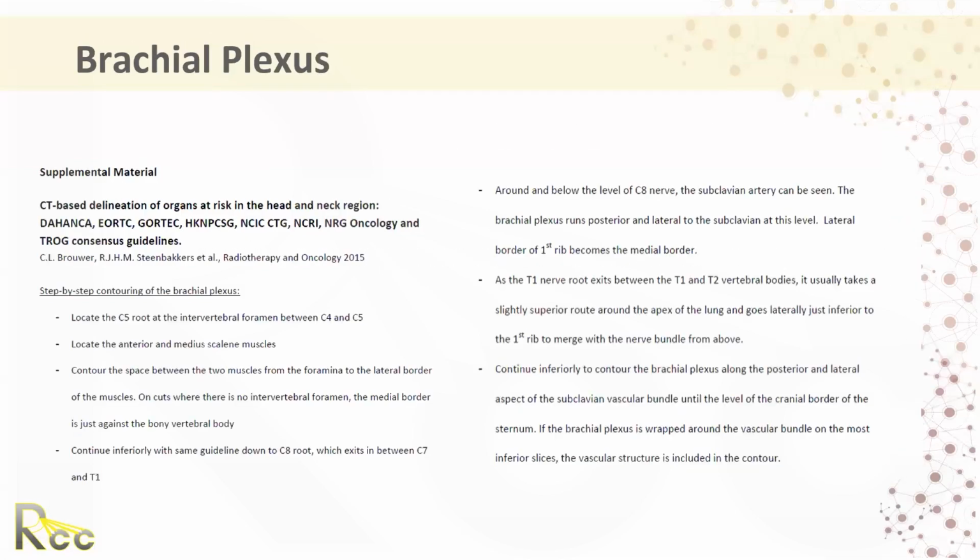Dr. Patel, are you contouring the brachial plexus for every head and neck patient you treat at level 3 and 4? I do as a routine practice, but I know that takes a lot of time. It's more important if you have gross disease in level 3 and 4. If you're treating level 3, 4 electively, it's probably less important. But if you're treating it with gross disease, that's where it becomes more of an important consideration.